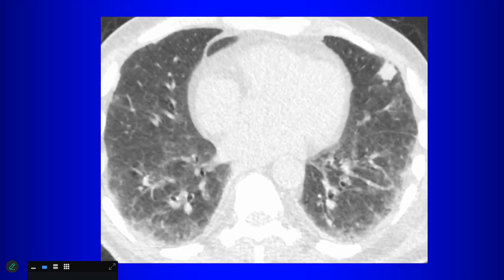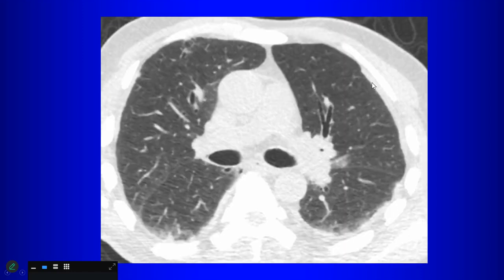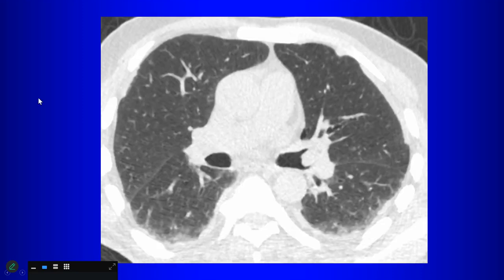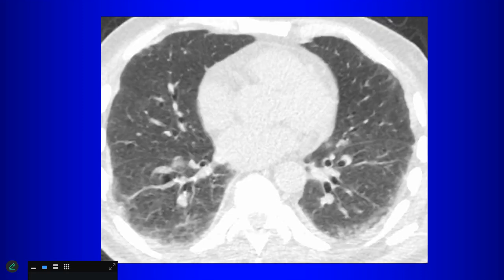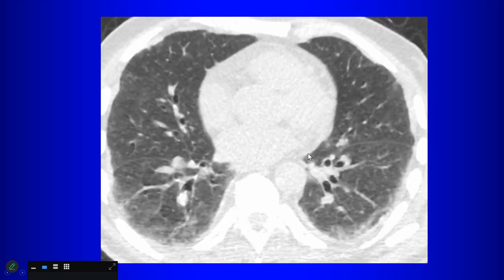Left lobe mass. For left upper. Yeah, so there's a mass here, right? Where is that? Yeah, so there's a mass in the lingula. Okay, tumor in the lingula. Maybe some other nodules, some pleural thickening, some funny looking stuff. Oh, somebody said what? Yeah, here in the left upper lobe bronchus in the airway.